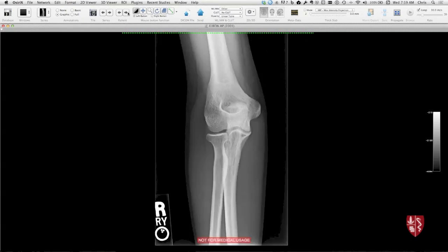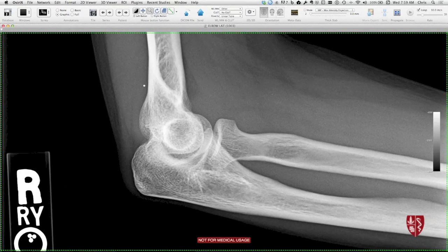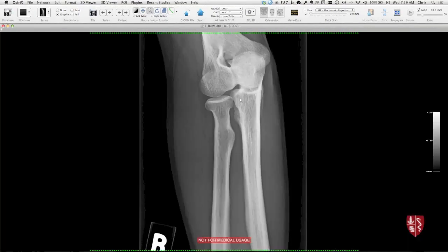All right. Let's see, what about this case here? One of the things you've got to do when you look at elbow radiographs is also always look for effusion. So, does anybody see an effusion in this patient? Yeah, good. You can see there's some lucency right in here. Let me zoom in on that a little bit. Do you see a posterior fat pad in this one? No, you really don't. So you might be on the boards thinking, okay, well, I'm not really sure. That's not really that ballooned out. But of course, you have to look at the rest of the case too.